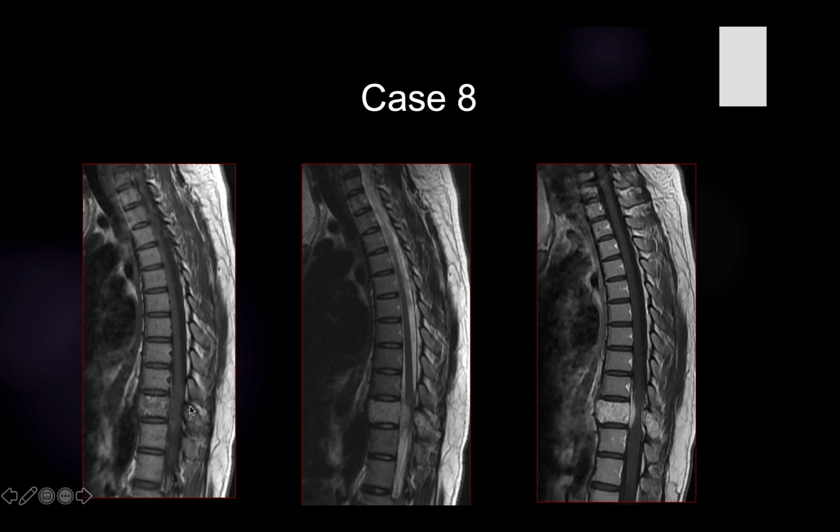This case is very important because many of us can consider this as a malignant lesion or metastatic lesion due to the association of extraosseous components, but this stippling appearance is very characteristic. The linear striation is also very characteristic, and also the areas of high signal in T1 are very characteristic and make the diagnosis of vertebral hemangioma, aggressive vertebral hemangioma, rather than an aggressive neoplastic lesion.